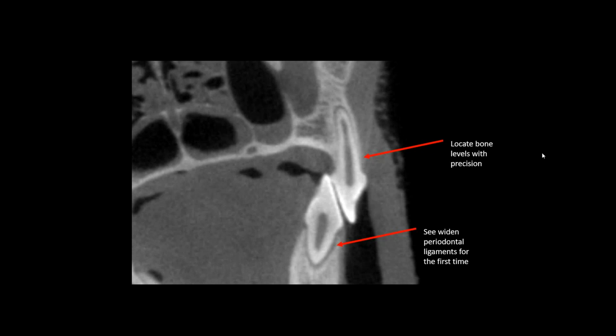Every cut is as low as 70 microns, typically 0.2, 0.3 millimeters. And of course, you now have cuts of CT in all sorts of directions that you're not used to seeing on typical 2D projections. As a result, some anatomic features that are normal are going to appear very clearly to you. And this is a quick example here. We'll look at that again in a couple of cases.